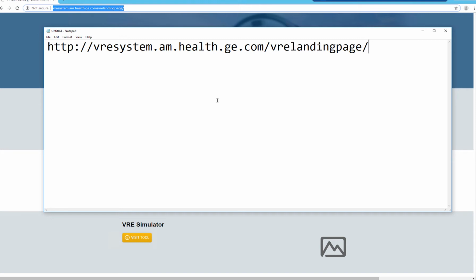This video is to help create priors using the VRE simulator, or the Virtual Radiology Hospital Virtual Radiology Environment simulator system.